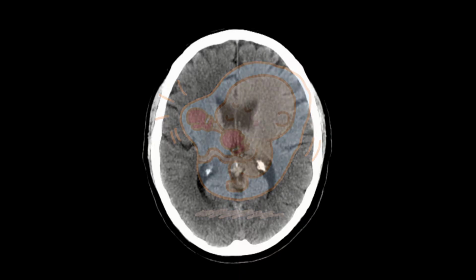Right, so moving on. So the brain is surrounded by CSF, which is harbored within the subarachnoid space. And remember that the subarachnoid space dips into the sulci. So the CSF occupies the interhemispheric fissures, and the sulci outside the brain, and within it is the ventricular system, which circulates the CSF all through the brain. CSF also has an additional nutritive function.